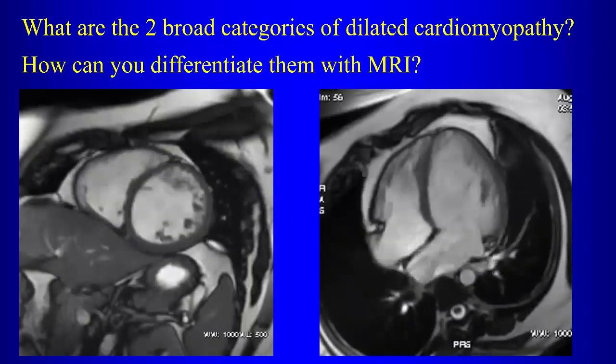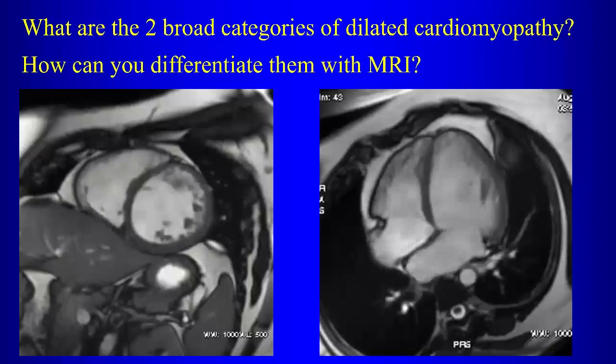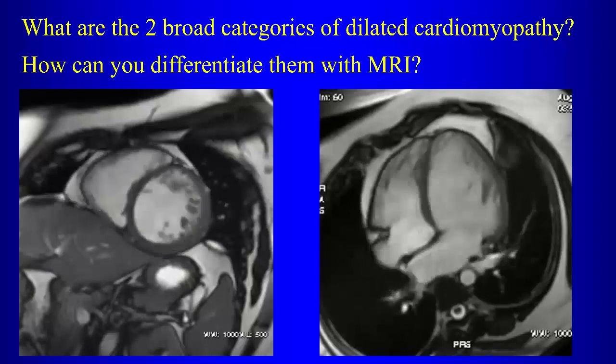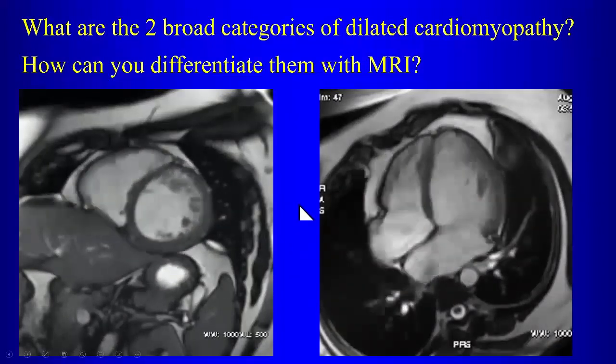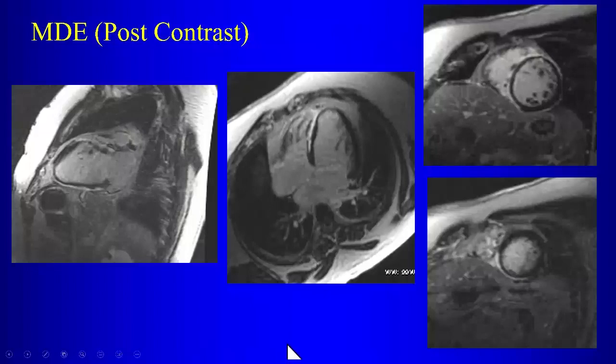Now, can MR help you to differentiate between those two possibilities? I guess. How? Delayed enhancement. Well, how is the delayed enhancement going to help? So ischemic versus non-ischemic cardiomyopathy, here's our delayed enhancement in this particular case. So tell me, is this ischemic or non-ischemic? Why? Oh, we got one vote for ischemic and one vote for non. So which is it?